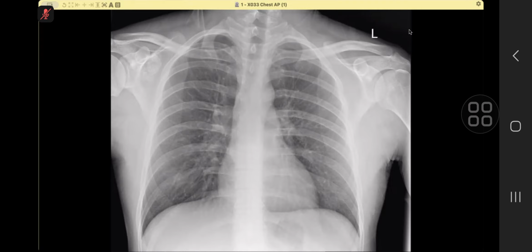Okay, in the rest of the lung fields, there is also an impression of subtle slight haze involving the right lower zone projecting over, I think, the 11th rib, and in the rest of the lung fields, I cannot make out any other significant nodule or metastatic deposits.